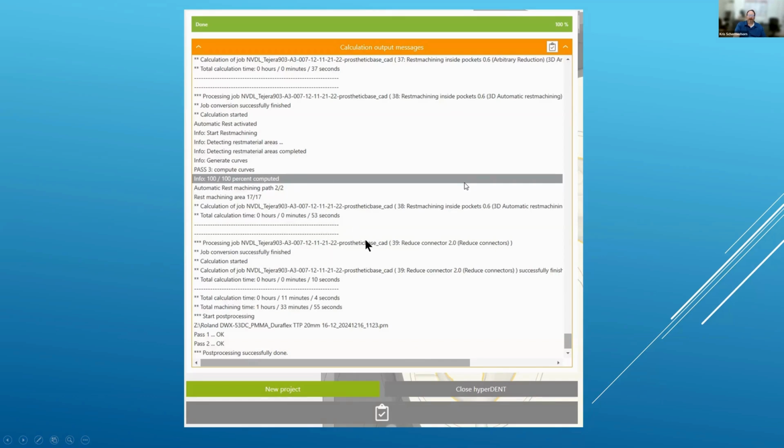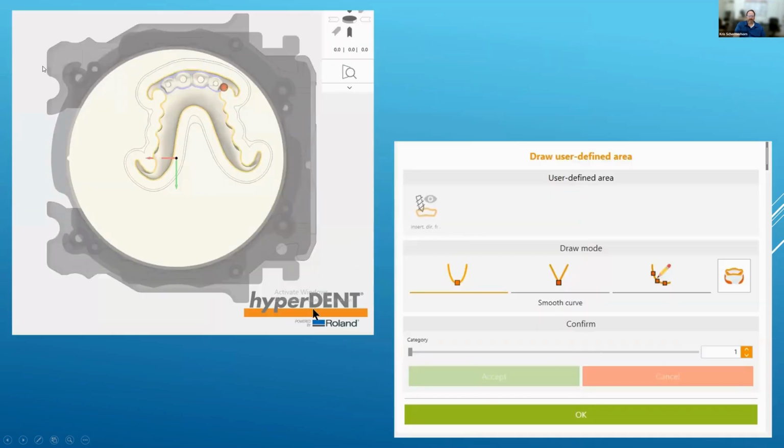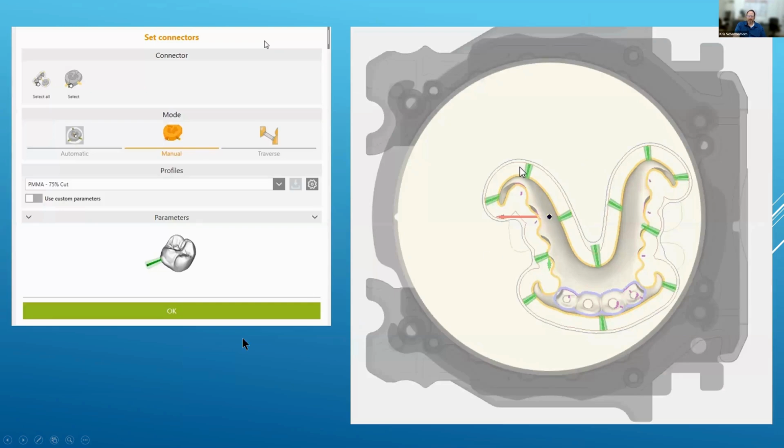That had a lot of undercut on the inside, which if you encircle a bunch, that'll add time. And then the sockets will add time. Generally, most cases were anywhere from an hour. It also has a lot of surface area. Anything that's bigger like this is going to take more time.